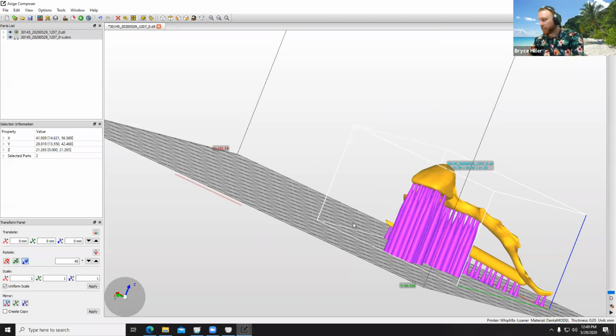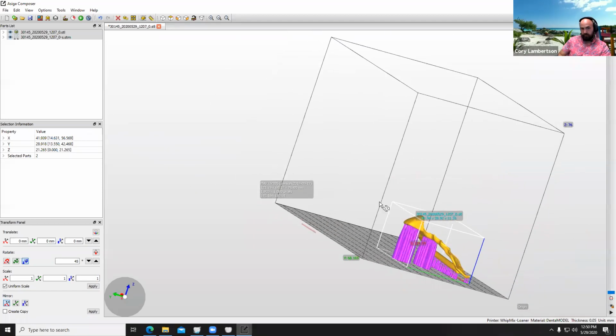And again, you could print this in either the denture tooth or the Dentka crown and bridge, depending on how long the patient's going to be wearing it. Just to reiterate, the Dentka crown and bridge is indicated for up to 30 days, and the denture tooth is indicated for, is it 2 years? That's what they did testing on, and the prosthetic lasts for 2 years or greater. It's a permanent structure. But it's used for denture though. Yeah, right. But something like this, you could print a couple of them.